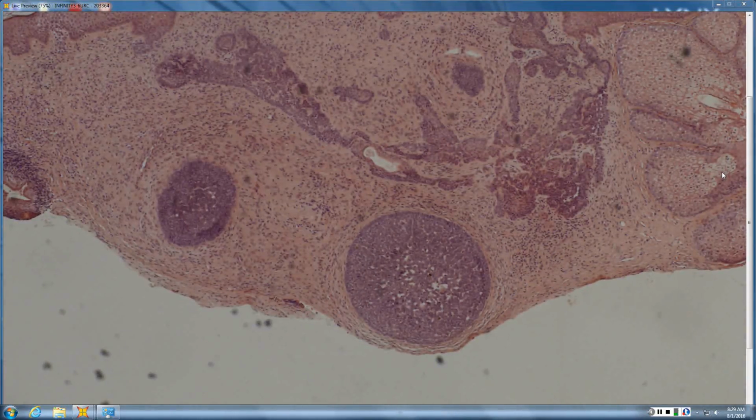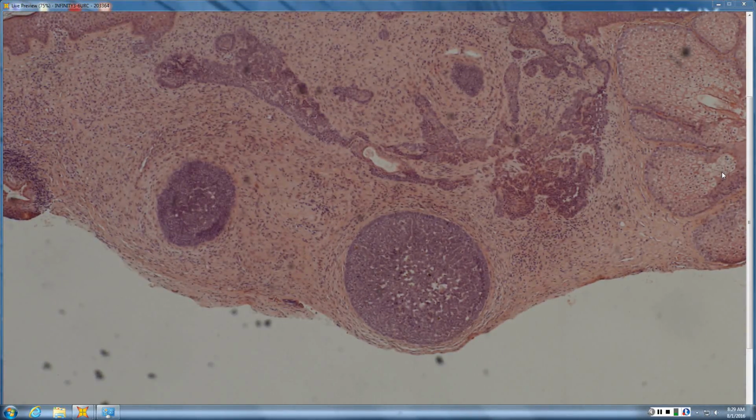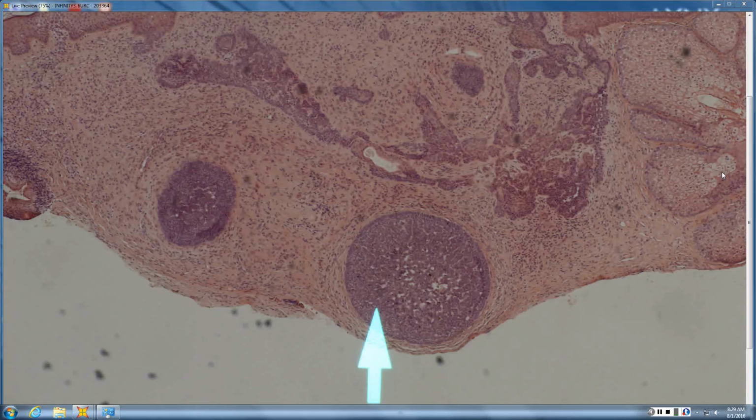Basal cell is going to be your daily sign-out. Then a trichoblastoma hits, and it's totally benign. How do you tell the difference? Lack of retraction and the stromal differences, even when it's arising off the epidermis like that. They can connect to the epidermis. So for trichoblastoma, the key is lack of retraction space.